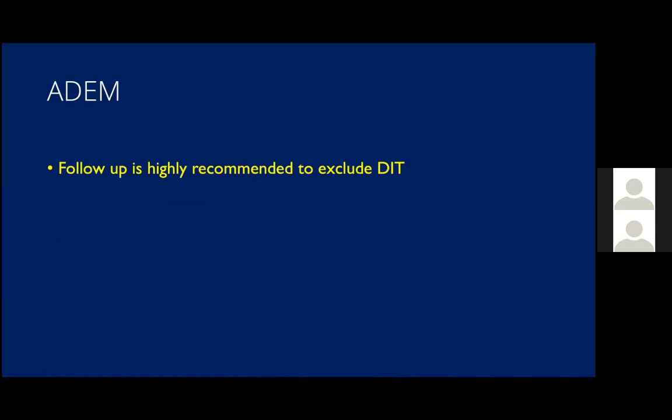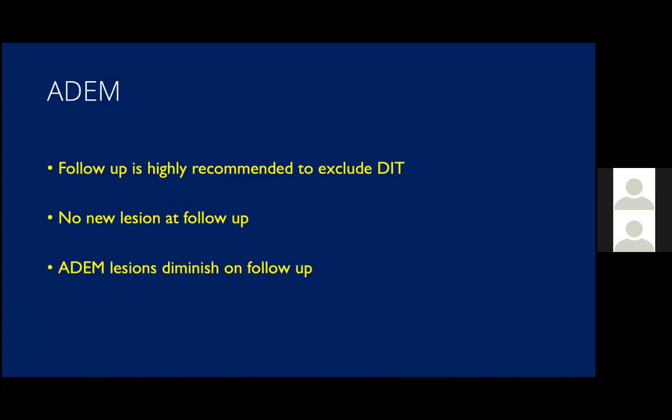And follow-up imaging is recommended to exclude dissemination in time. As I told you, in this particular case, follow-up imaging was not performed. I checked our hospital system, and no new lesion should develop over time. That is also important for ADEM as a diagnosis. ADEM lesions should go away in a follow-up examination.